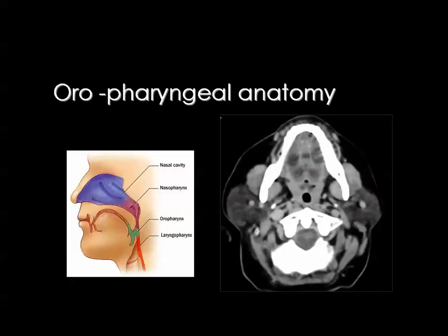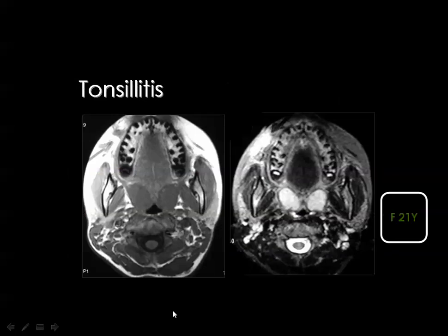Then we're still on the medial aspect of the parapharyngeal fat and going lower down to look at the oropharynx. Then the oropharynx has no anatomic features. It is formed or surrounded by the pharyngeal constrictor muscles, which separate the air column from the parapharyngeal fat.